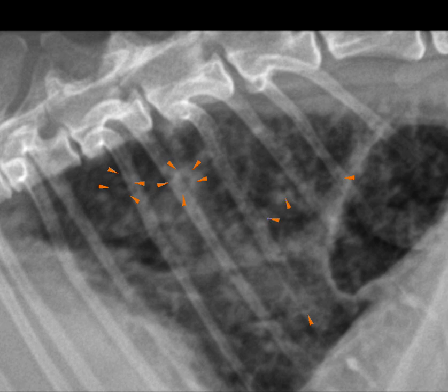In terms of a third criterion that I really like to tick the box on when I'm diagnosing a bronchial lung pattern, I'd like them to be, when possible, located fairly peripherally. The reason I say that is, again, with a digital image on a really nice radiograph, sometimes you're going to see some of the larger bronchi, but that's going to be manifest closer to the hilus of the lung.